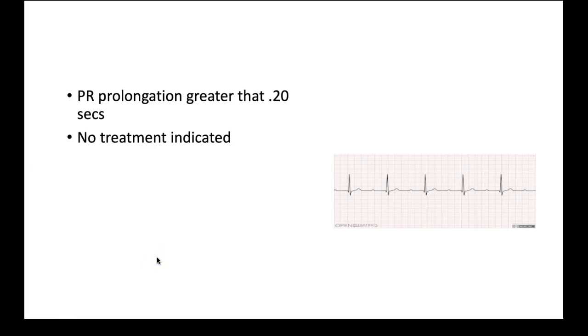So this is a first-degree block. You see that PR interval? It's prolonged. It's greater than 0.20. And there's no treatment indicated for this. This patient is pretty stable.